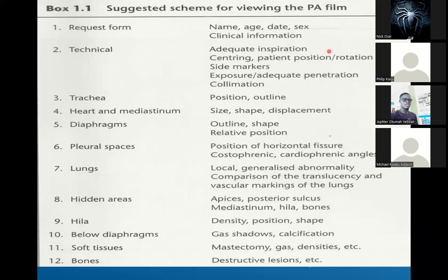We'll look at how to calculate the size of the heart to determine whether it's too big. But with experience, if you see a chest X-ray on which there's enlargement of the heart, cardiomegaly, you're able to spot it. However, if it's not that obvious, there's a way to calculate and determine if the heart is enlarged or not.